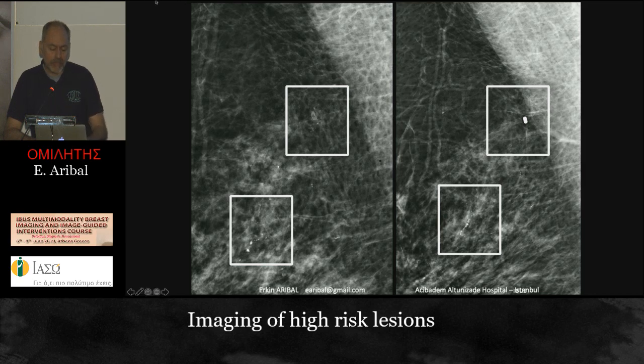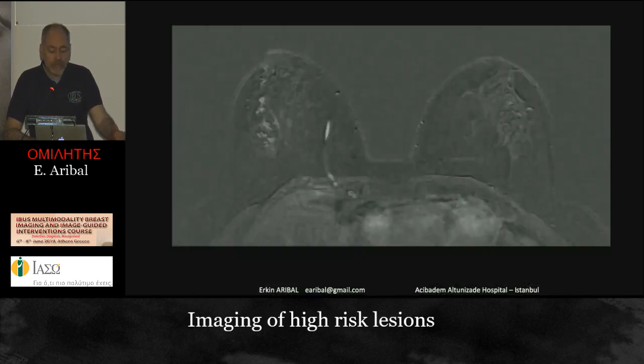She removed every calcification here, but she missed these calcifications, maybe. Maybe she thought that it would be sufficient to just biopsy these ones. So I told her that these calcifications were quite suspicious and she needed another biopsy, but she didn't believe me, neither her surgeon. So we had an MRI.